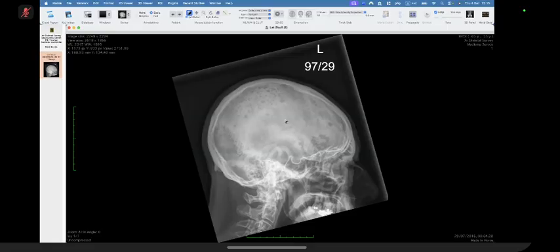Right. The posterior occipital area has also got some focal area of lucency in a rather well-defined fashion. Ignore that. So the only finding that I can see in this are these multiple variable size lytic lesions diffusely spread across the calvarium without any associated soft tissue.